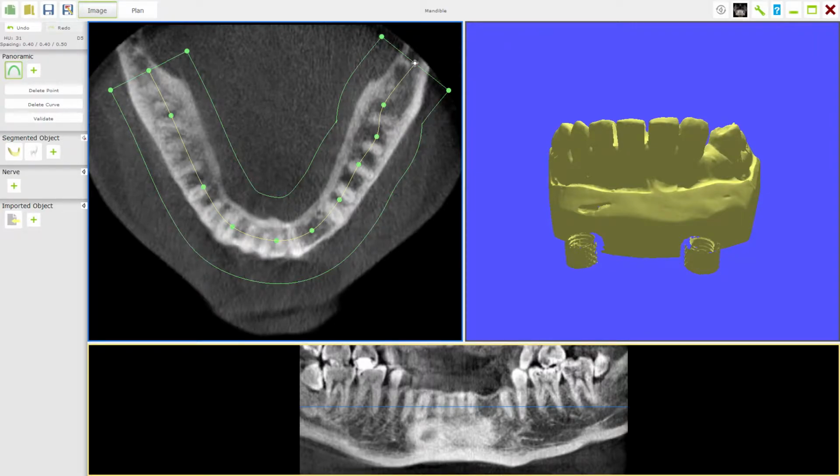If you look at the image you can see that we're getting far more information. Now this area here, that represents the mental foramen where the ID nerve would be entering. So we could position our slice more over there, and as I do that you can see how much detail is now coming out in that region because the slice is going through there. I can again move this and improve on the image clarity, and you can imagine the nerve is running along here. I can then move this area here, and again you can start to make out the lower border of the canal.